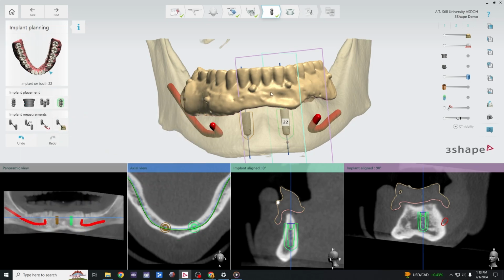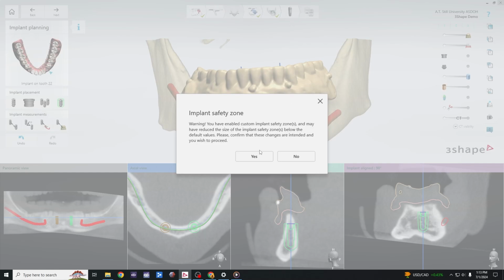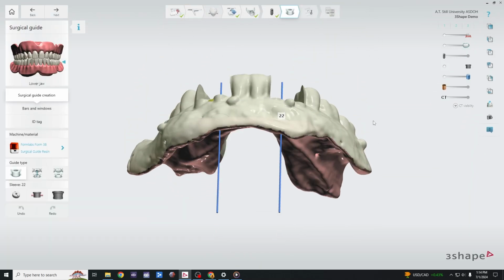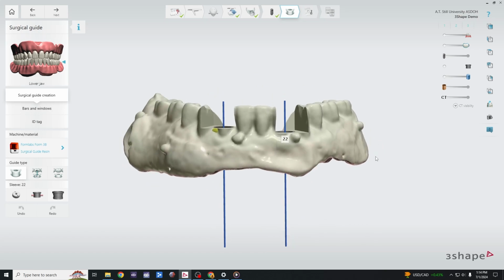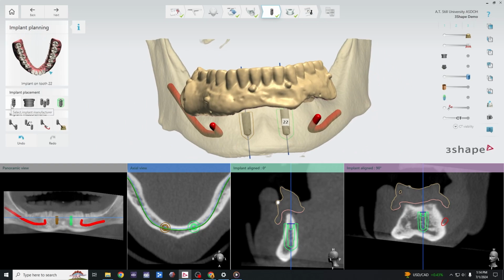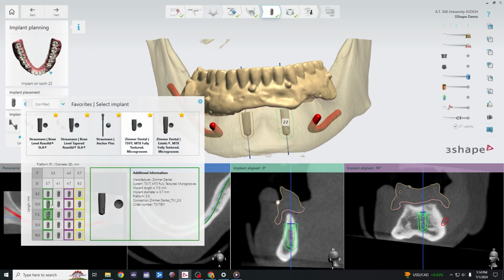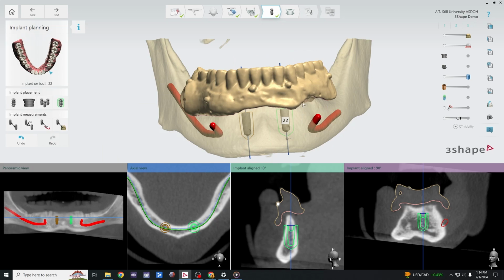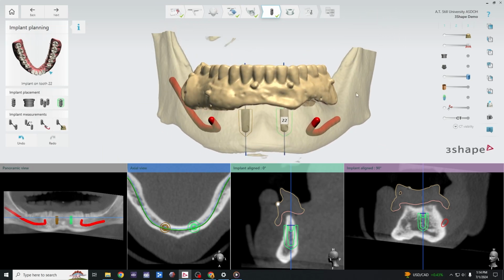And everything that you change gets updated at these subsequent windows here. So don't worry about doing anything that's irreversible. The software does save automatically by itself, so again, you don't have to worry about hitting save. And even if you close the program, you'll be able to recover the files here.